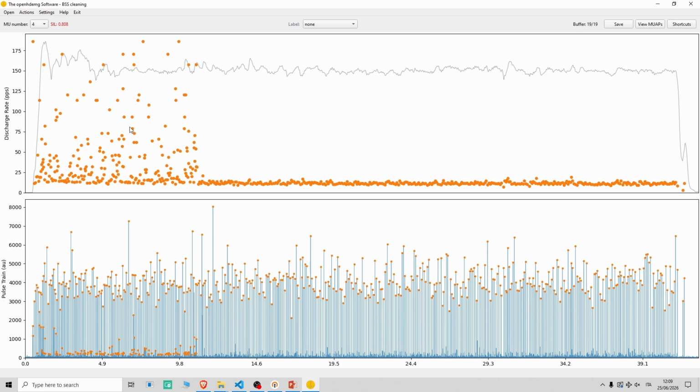And of course, we can see it by eye, but sometimes this is not so clear. Therefore, we have an objective measure of the quality of our motor unit detection. I hope you at least understood that it's extremely important to clean motor units, and that's why we have developed a tool that really focuses on being user-friendly and providing all the information that you need to do so.